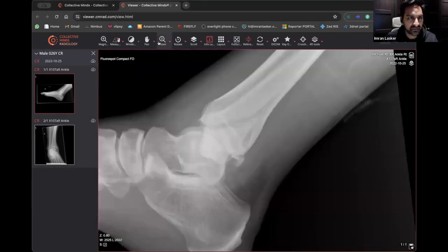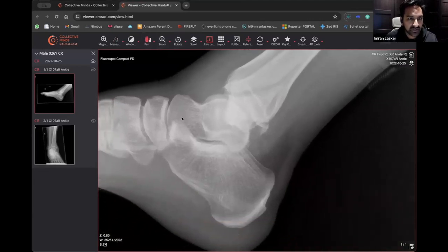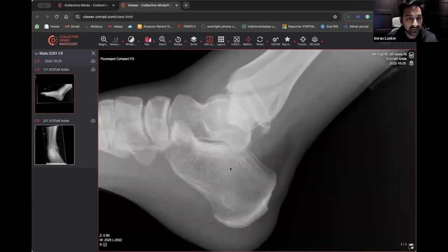So everything else looks okay. Then you want to make sure that there is no calcaneal fracture as well. The way to do that is have a look at the trabeculations, and make sure that you can see the trabecular pattern going all the way along like this. If there's any disturbance in that trabecular pattern, then you will be concerned about a calcaneal fracture. But there's no calcaneal fracture. We can pretty much say that it's most likely a lateral malleolar fracture and a fracture through the posterior tibial plafond, with most likely some articular surface involvement as well. No other fractures at all on this one.